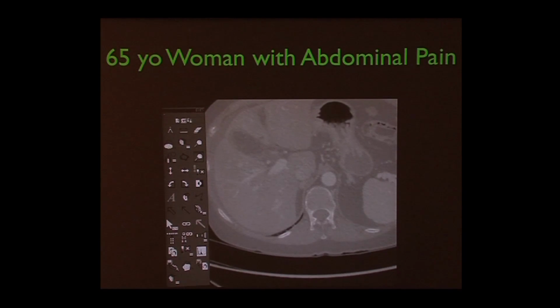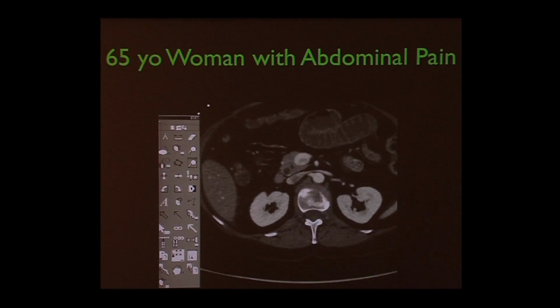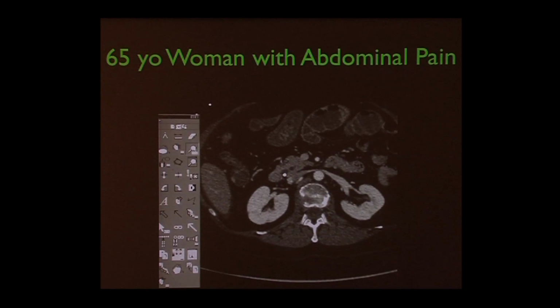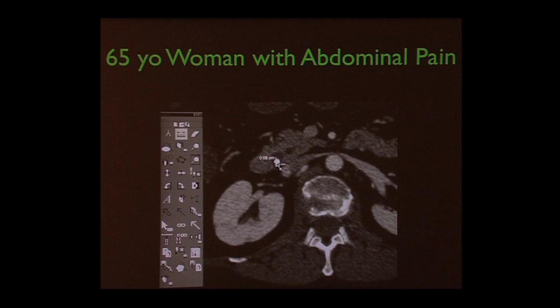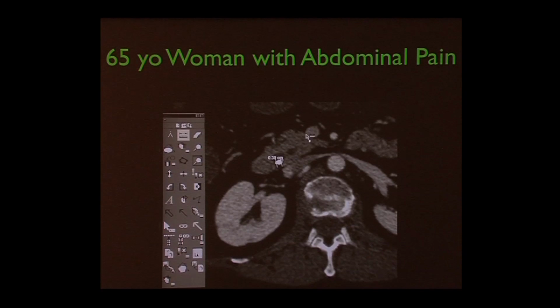So that was looking at the lung windows, as we call them, looking for lung detail. Here we're back in the soft tissue detail and going through, again, I can stop anywhere. I go back to that little white thing. I can magnify, I can move it around, I can pan, I can measure things. What do you think that thing is? It's a white area. So what does white mean? It's really that white. It's really dense. And it's surrounded by dark. It's surrounded by fluid. It's a stone, but it's not a kidney.